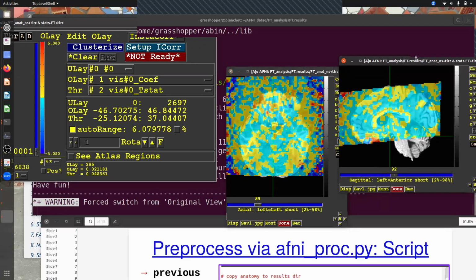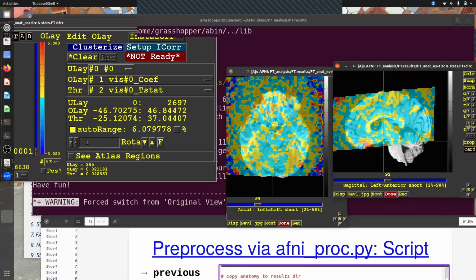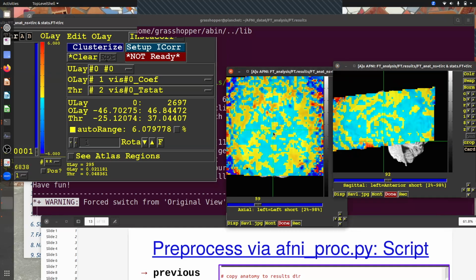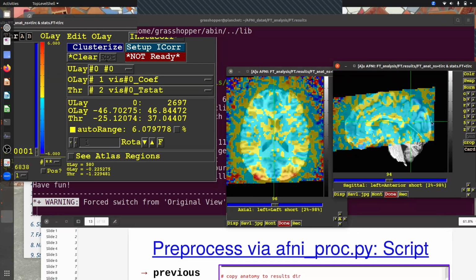So this data set looks a little different. It's been aligned to a standard template brain. So I'm underlaying the subject anatomical. And this is the result of our general linear modeling. It looks kind of messy. One thing you'll notice is there's results everywhere, not just in parts that overlap where the brain is. We have signal that we've estimated everywhere, and we can perform general linear modeling to basically ask the question, which parts of the brain look like they're involved with my visual stimulus?